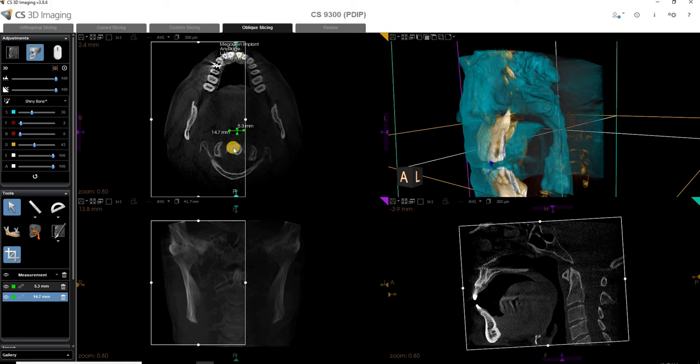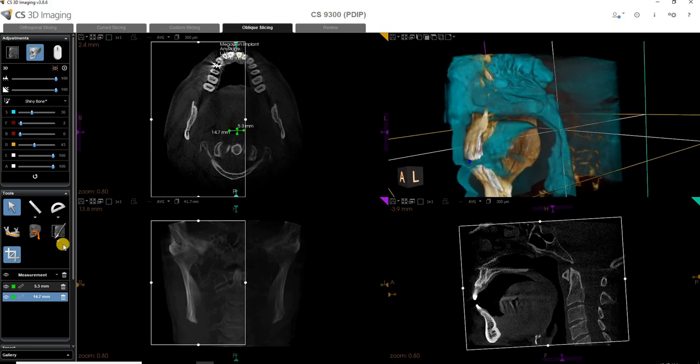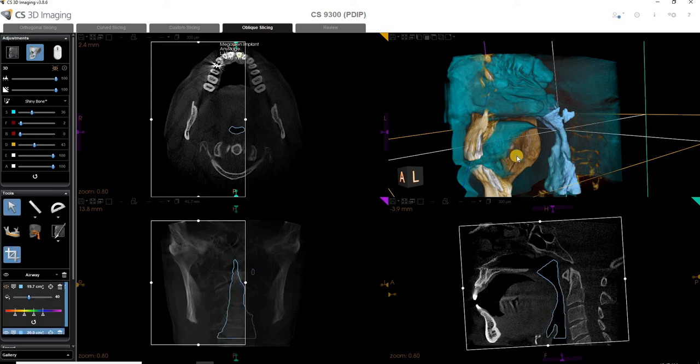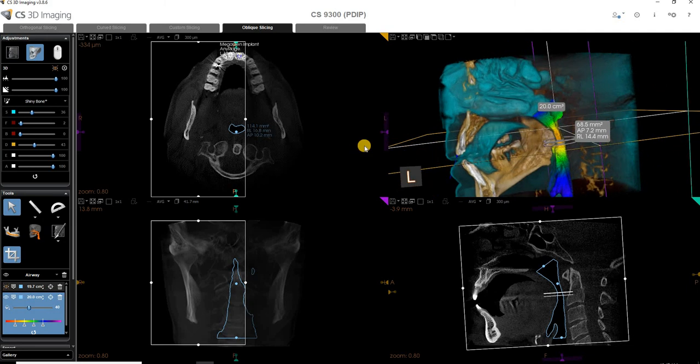As you can see, there's a few extra steps that are involved with this. The easiest way to do that is just to use the airway module. And it gives you everything that you need. I hope this helps out.